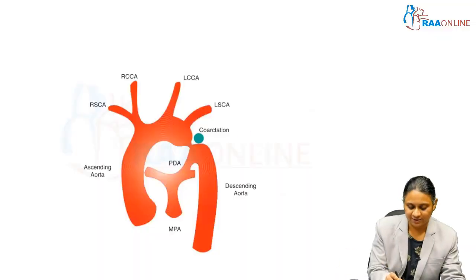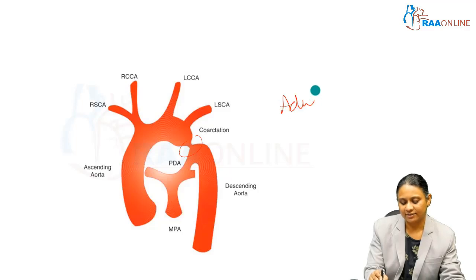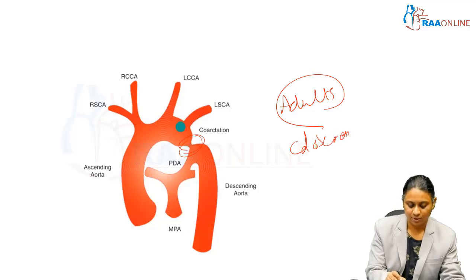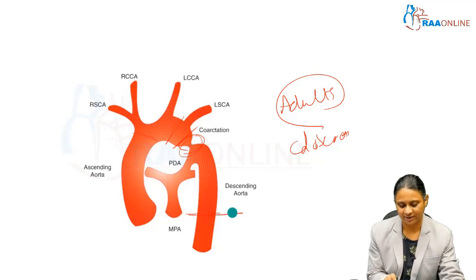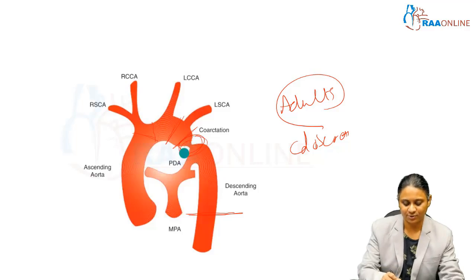This is the coarctation segment. Here it is very discrete. So in adults, the commonest type of COA is a discrete COA. Here is just the obstruction, while the rest of this is the isthmus. This is the arch. The diameter of the ascending aorta, or usually the comparison point, is the aorta at the level of the diaphragm. So here the diameters are maintained and there is a discrete or focal coarctation of the aorta. You can see it is just next to the PDA, post left subclavian artery.